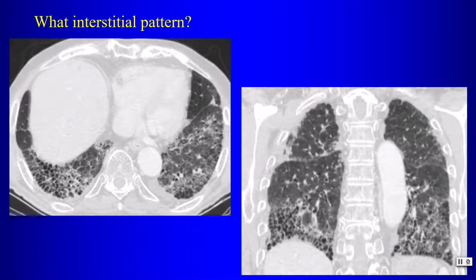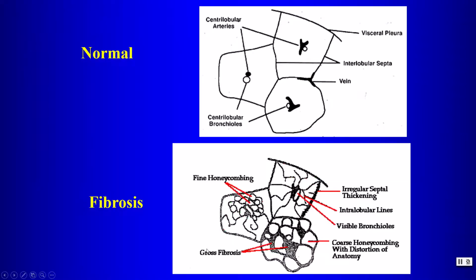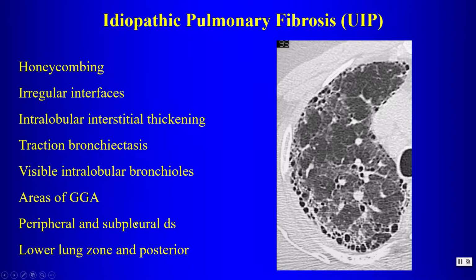So if you see a disease like this with these findings of honeycombing here in the periphery of the lungs, more predominant at the lung bases, we should think about, here's diagrammatically, you can see the fibrosis and the honeycombing. Idiopathic pulmonary fibrosis in this case. This is a UIP pattern in this particular case, and we have covered this in the findings associated with idiopathic pulmonary fibrosis.